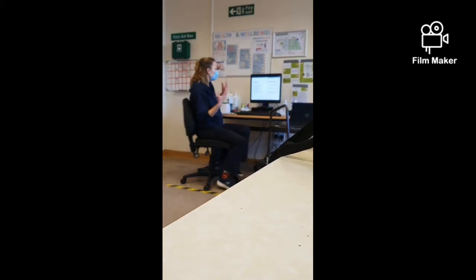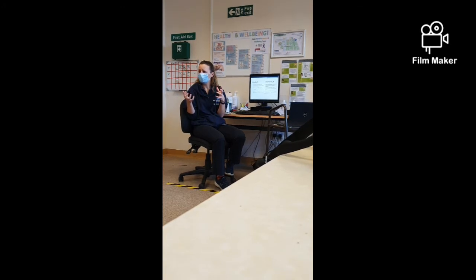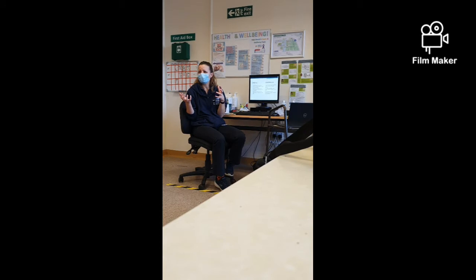Cardiac, so your heart. It should be less than 50% of the total thoracic window. Does anyone know if the heart is bigger, what that's called? If you've got a really big heart, do you know what that might be called? Hypertrophy, not hypertrophy, something like that though. Cardiomegaly? Has anyone heard of that? No, I've never. So an enlarged heart.